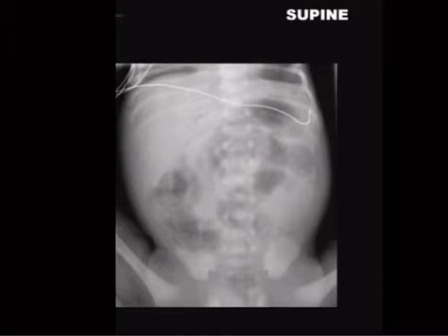We've got something that sort of looks like we might have NEC going on here, some bubbly stuff. So how can you tell if it's NEC versus poop? Practical pearl is you call up the floor and you say, has the kid eaten or not? If he hasn't eaten, he doesn't have poop, and then it's more likely to be NEC. Sometimes you just can't tell and you just have to watch for serial imaging. Is that bowel loop staying similar? The poop should move, right?